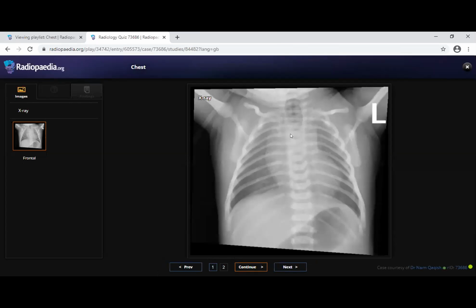Yeah, this is a case of tracheoesophageal fistula. And you have mentioned the VACTERL anomalies that you look for. Anyway, in this image, the vertebra appears to be normal. There are no particular findings with regards to the skeletal system. Regarding the heart, is it okay? The heart, yeah, you can say this is a boot-shaped heart with the tetralogy of Fallot.